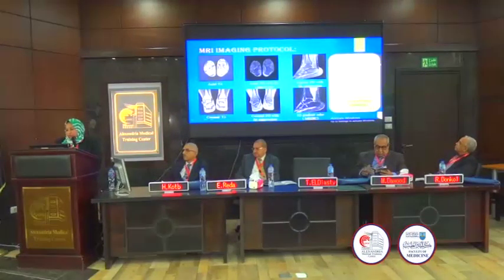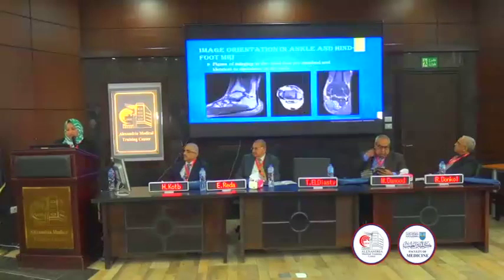The T1 weighted image provides good anatomic detail, and the T2 weighted images with fat suppression are useful to assess the osseous or soft tissue edema, which are the hallmark in most pathologic conditions.